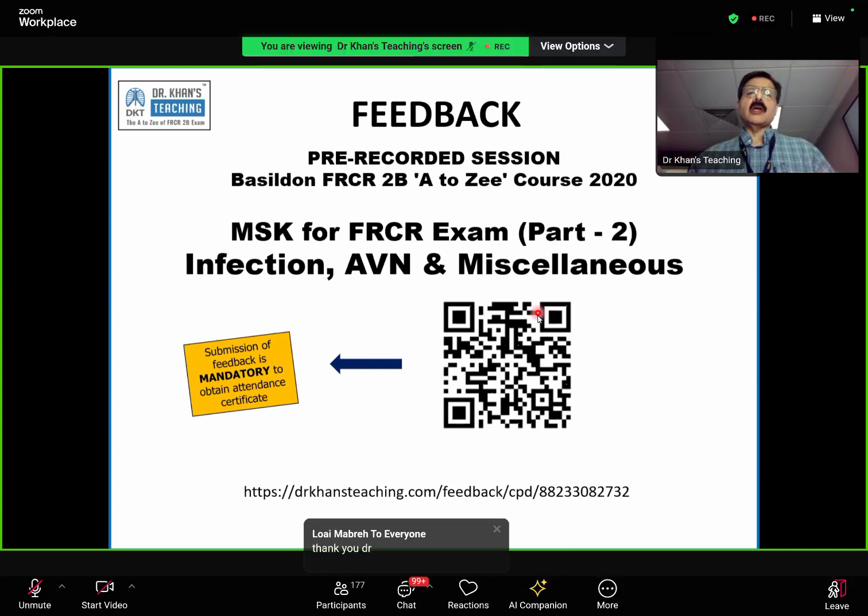The last case was hemiatrophy in the surgical field, where radiation was given because of Wilms tumor, which included the ilium and the left side of the vertebrae, and that is why they were smaller in size.